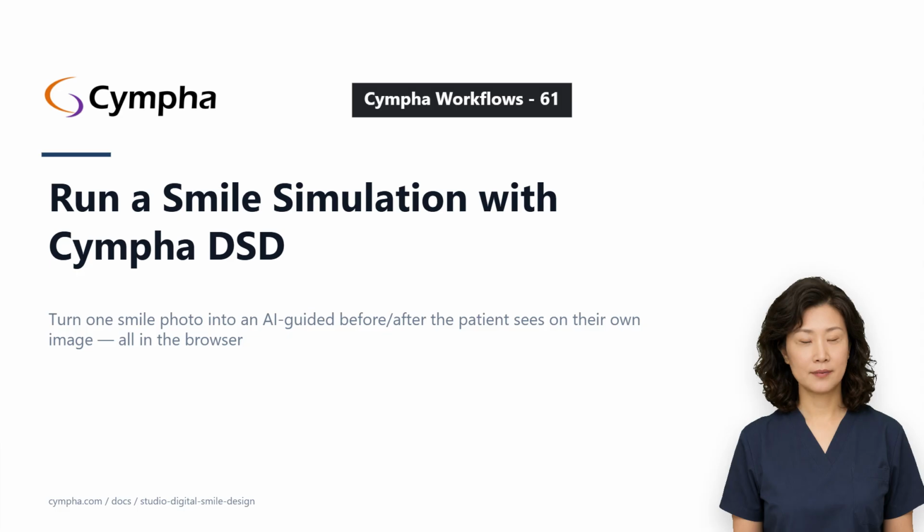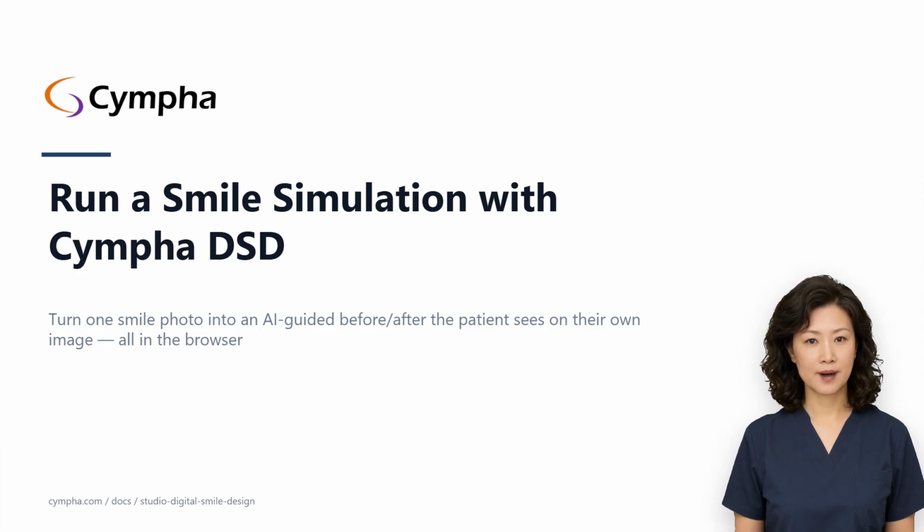The DSD workspace in Cympha Studio turns a single two-dimensional photo into an AI-guided before and after that the patient sees on their own image, and the whole thing runs in the browser. No install, no CAD seat, and no upload of the patient photo. This is a short one, built for chairside use.